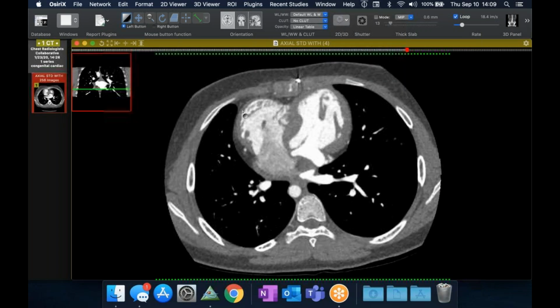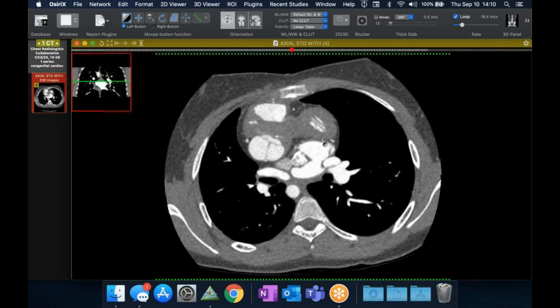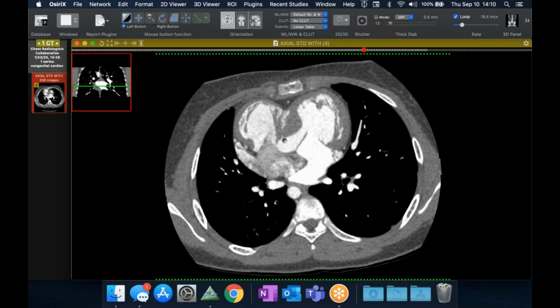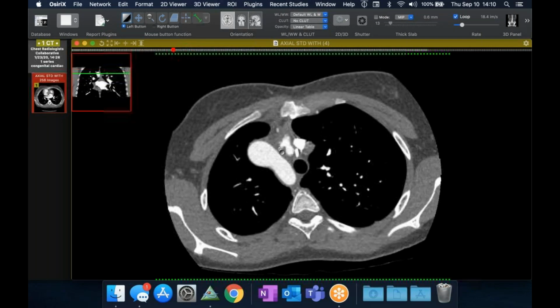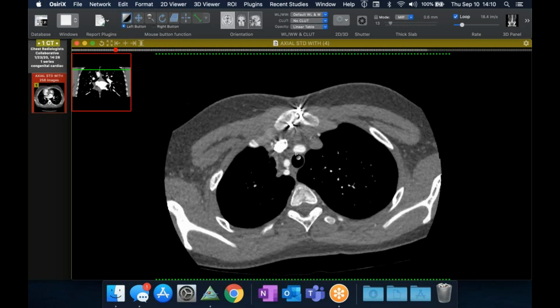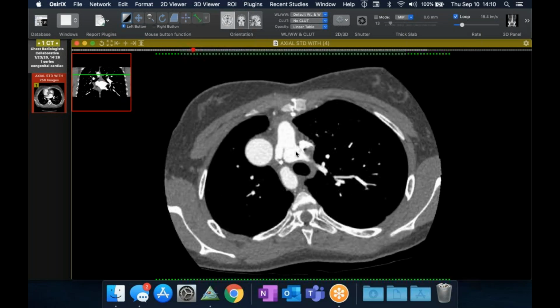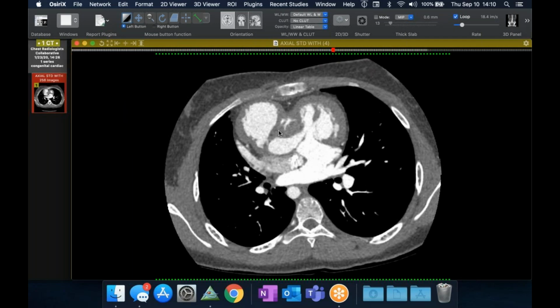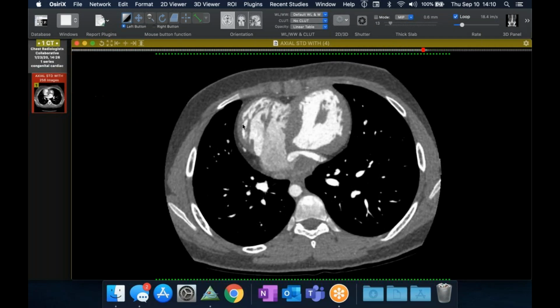There we go. You can see that this right ventricle is abnormal. I'll go up and find the vessels here. This is the aorta, and it's coming off here, sort of overriding the septum. There's the aortic arch on the right, and then you see a kind of interesting crossing vessel anterior there, and it descends on the right. The pulmonary artery is here, and you can see it's already been repaired, and it comes off anteriorly here, so it's a repaired double outlet right ventricle, and it looks like that RV is pretty unhappy.